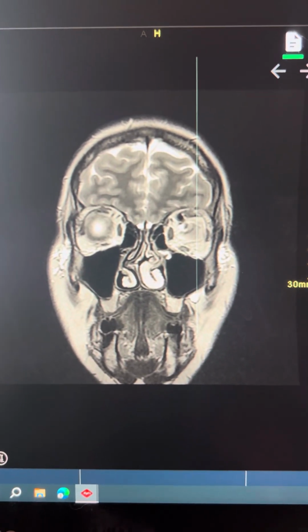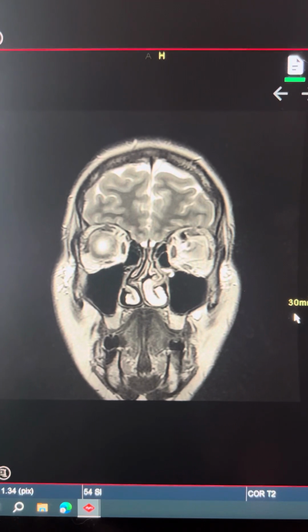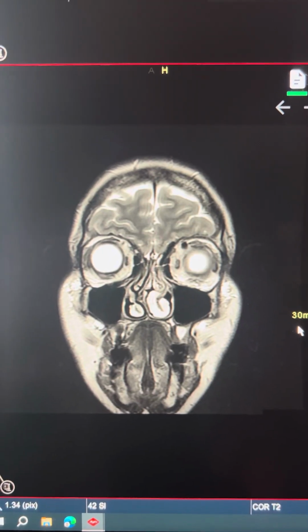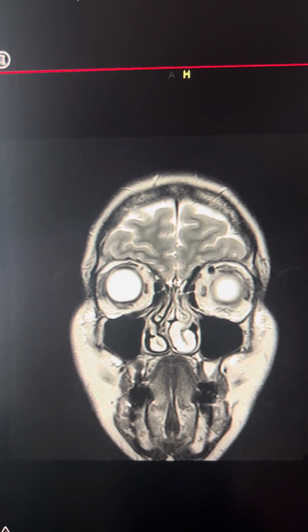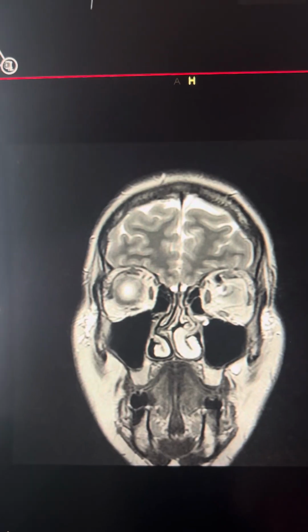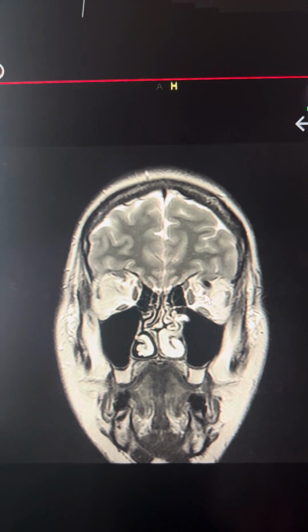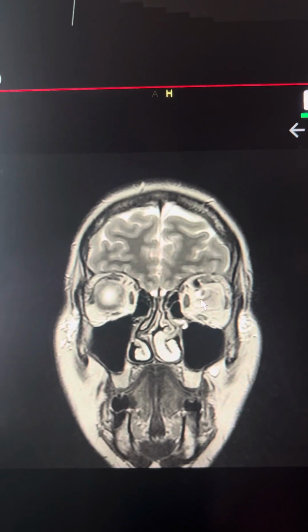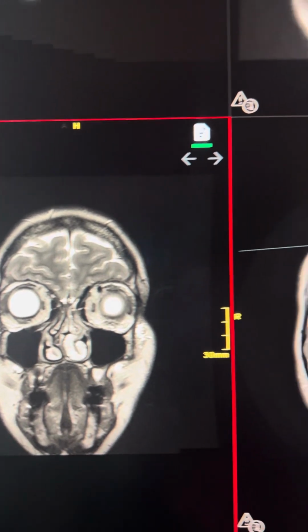This is a young 36-year-old patient who presented with some proptosis, and she has a tinnitus-like pulsation. MRI was done that showed this dilated superior ophthalmic vein on the left side. So you can see this vessel is quite dilated.